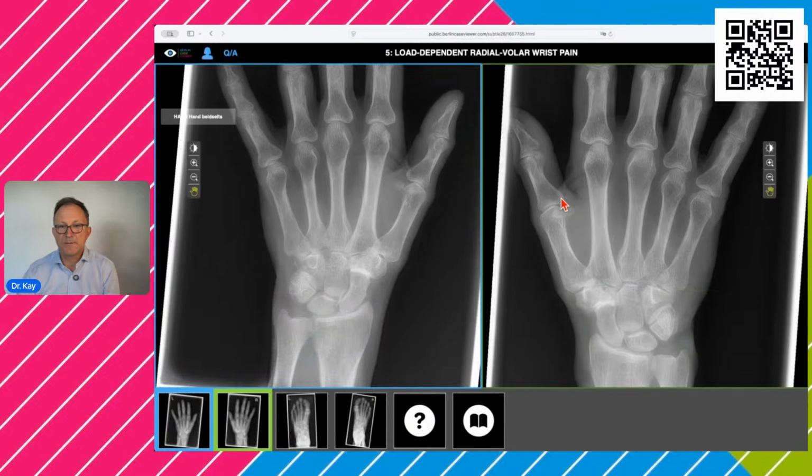And then looking at the wrist, we see the CMC joints over here, also CMC joint 1, which is usually affected by osteoarthritis. And then we have the radiocarpal joint, looks nice, no joint space narrowing. We have the intercarpal joints here, except this joint. And this joint is called the STT joint, the scaphotrapezoid trapezium joint, connecting these 3 bones.